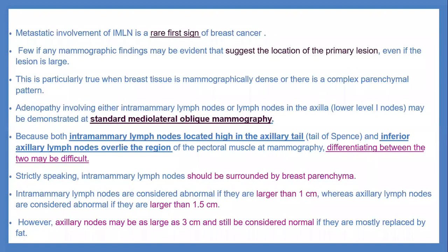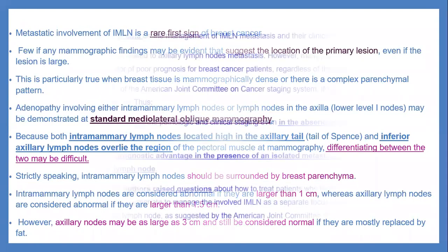However, axillary lymph nodes up to 3-4 centimeter can still be benign or normal, residual of previous reactive or inflammatory adenopathy. It persists as a large lymph node approaching 4 or even 5 centimeter, but you will find abundant fatty hilum. It will be replaced by fat in this case. You got my point? Okay.